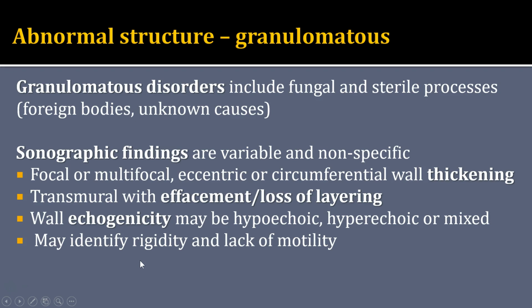The granulomatous disorders can cause focal or multifocal lesions. They tend to be eccentric or circumferential wall thickening. And different from inflammatory disorders, these are transmural with effacement or loss of layering. So that can help us get away from just routine inflammatory like IBD. The wall echogenicity can vary as well, hypoechoic, hyperechoic, or mixed. And then we may see some changes to peristalsis and see rigid looking segments.